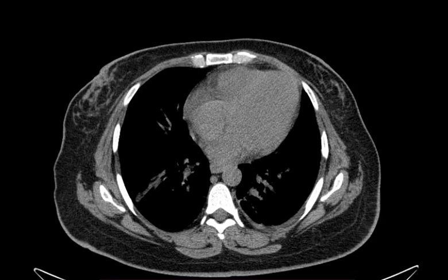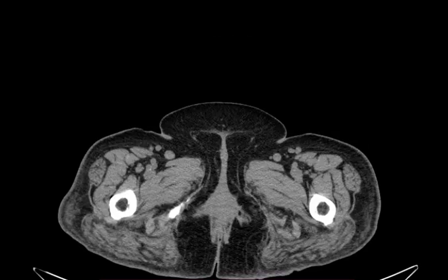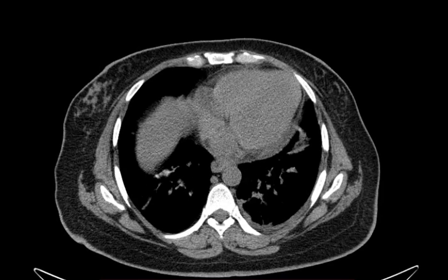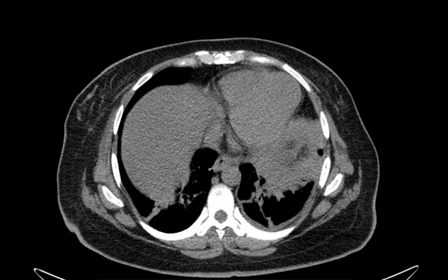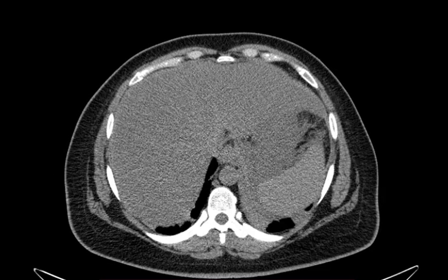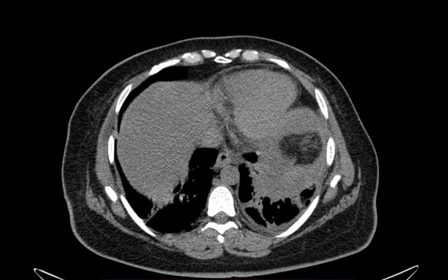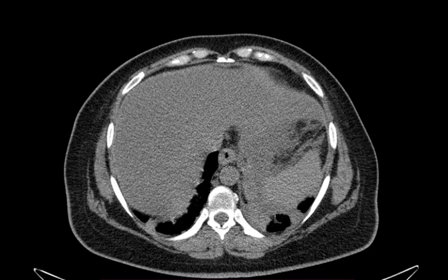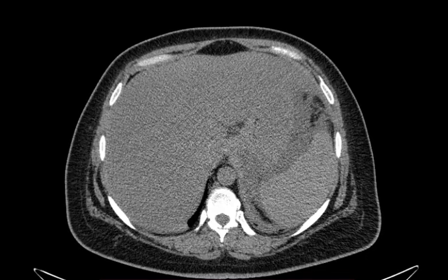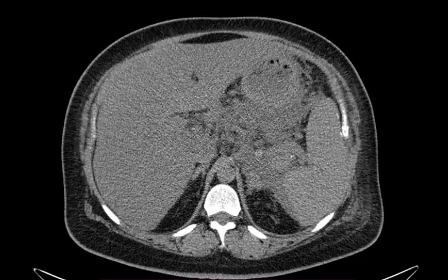So a CT scan was ordered for her and this is the CT scan, and let's see what you have to comment. As a matter of fact, it's not a recent case, it's a little bit old, so I'm not quite sure what the findings were. We will try to see it together. So just scan and tell me what you see and describe.